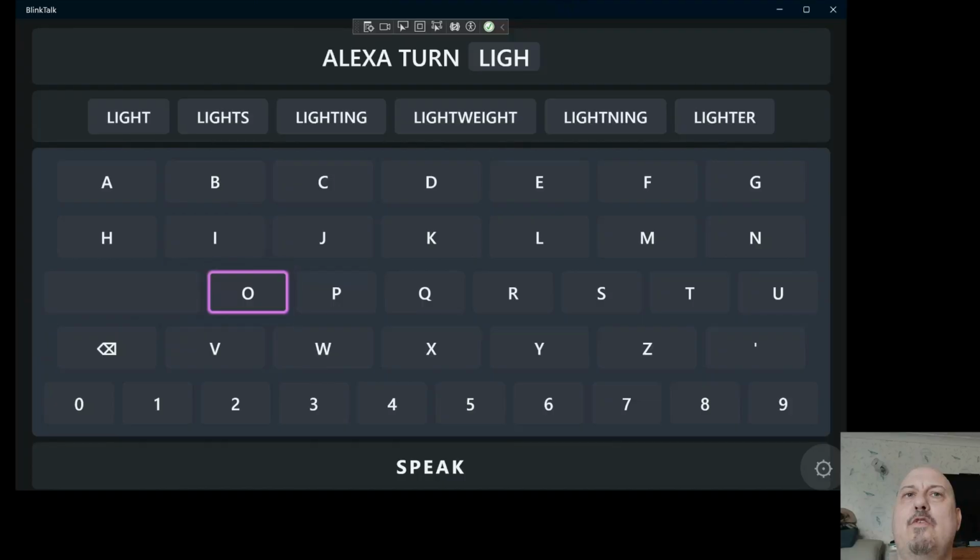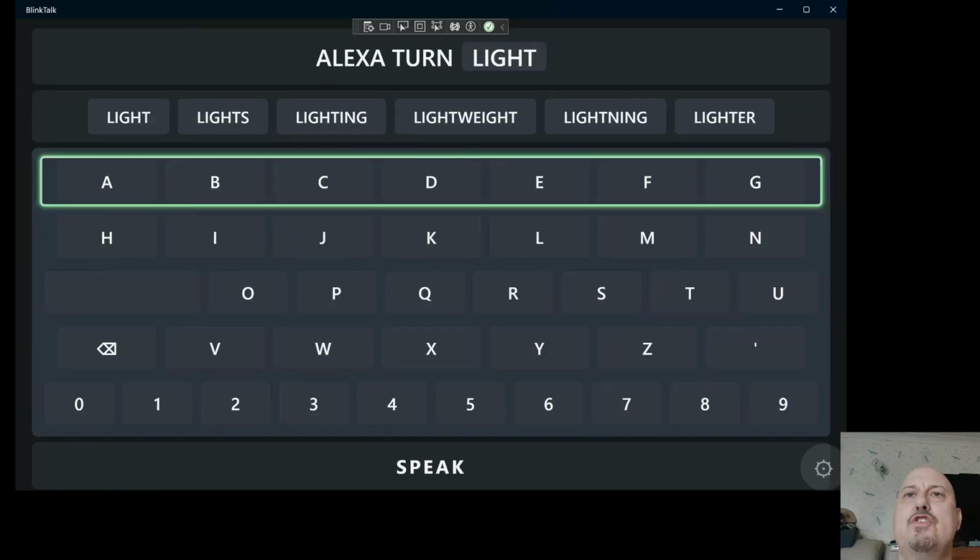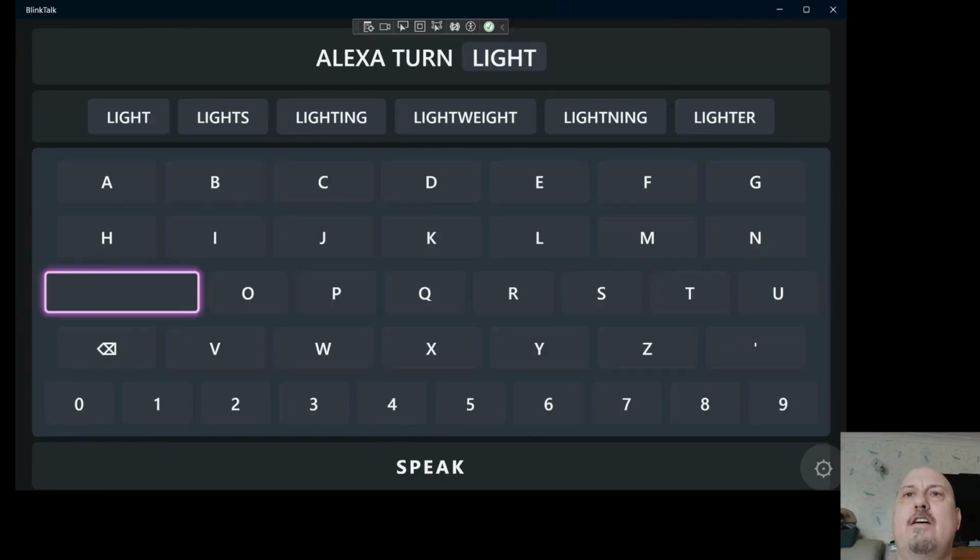And you see the short look up time is really good. It's much quicker than holding your eyes closed for half a second.